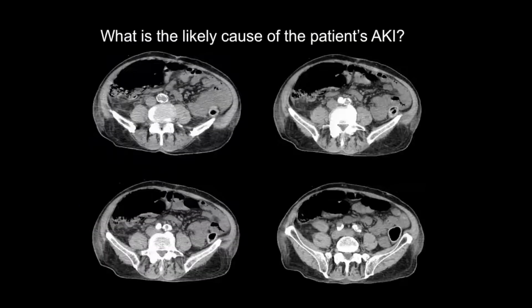So what's the cause of the patient's AKI? So I'm going to show you, here's some pictures from the patient's CT. I still haven't shown you the CT image of the kidney, but that's not really relevant to here.